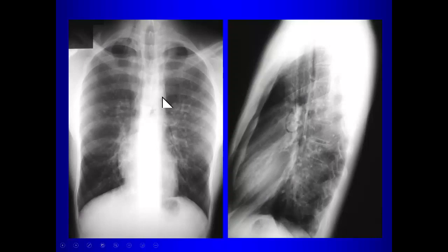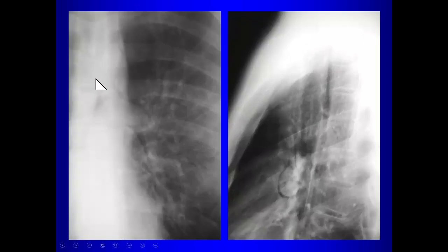Here, this patient has air tracking around the left pulmonary artery. The air dissects up into the neck. That's why you can have crepitus on physical examination. Here, there's air outlining the pulmonary artery. Here's a close-up. The air outlines the pulmonary artery here in this patient. And there is an underlying disease that can result in very high airway pressures that can give the patient a spontaneous pneumomediastinum. What is that disease?